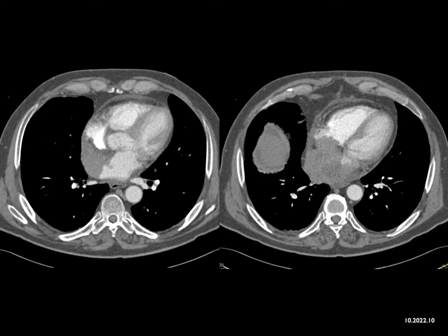It's a possibility. Metastasis to the heart, you can have direct extension from, let's say, mets to the lung, growing along the pulmonary vessels. That's a possibility, but I don't see any masses. This looks primary to the heart, so it could be, but I couldn't exclude it. But the most likely diagnosis is B-cell lymphoma.